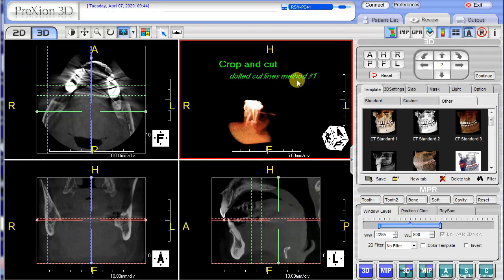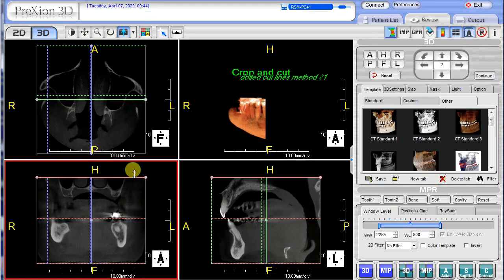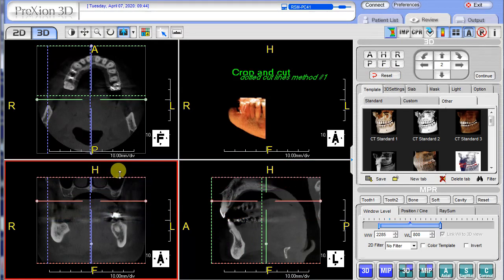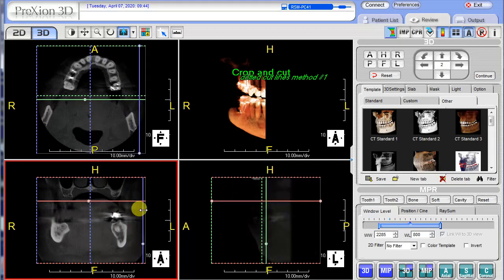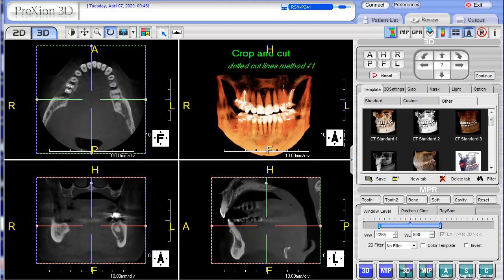When completed, to return to the original image, hit the Reset tab and just drag the cut bars back to the original locations. Remember, these are picture frames on the outside, if you will, and just drag them back to their original locations. So when all your cut lines are back in their original positions and you hit reset, this is how the default load screen looks.